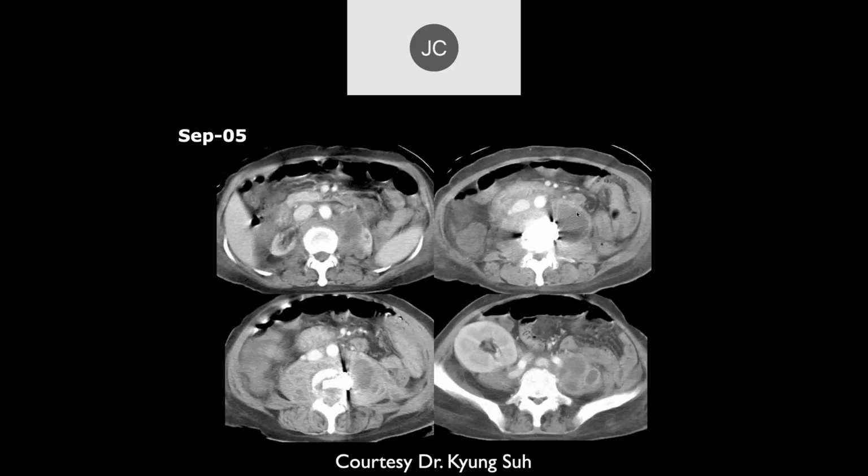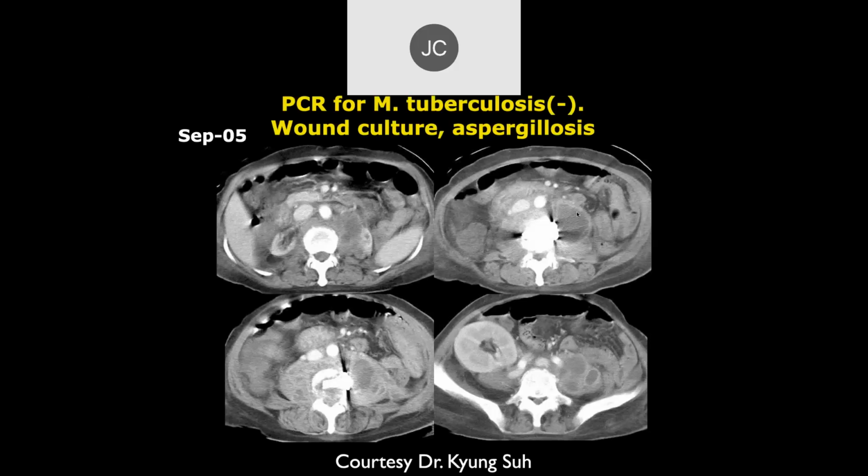I don't know. That's very characteristic of TB. You can get massive abscesses, but in this case, the TB was negative. But if you see large abscesses in someone who's not all that sick, especially in the spine area with kind of spotty disease, that's usually going to be TB, chronic TB. In this case, it was aspergillosis, which is much less common.